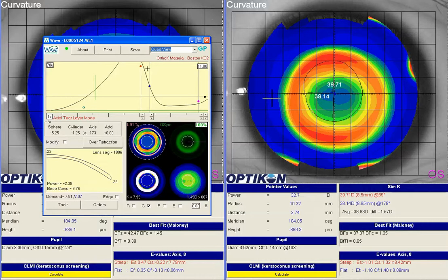So over here, now we've got a lens that's about 10 microns more shallow than the original lens. I think this should be able to sit a little bit higher, and even though we're not really changing the size of the zone, changing the position of the zone may help. So those are my thoughts.